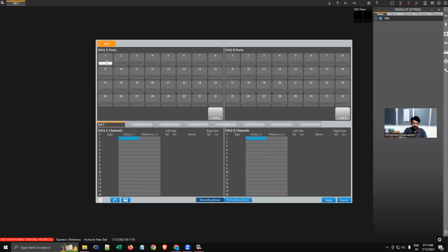Okay, so I'll be just naming them. Whatever you name them, it hardly matters. These are just names, names of the electrodes that you are putting in. So F1, F2, F3, and F4. Okay. So now, as convention, your left ones are named as odd numbers and right ones are named as even numbers. So let's just set up the 2 channels that we are going to do.